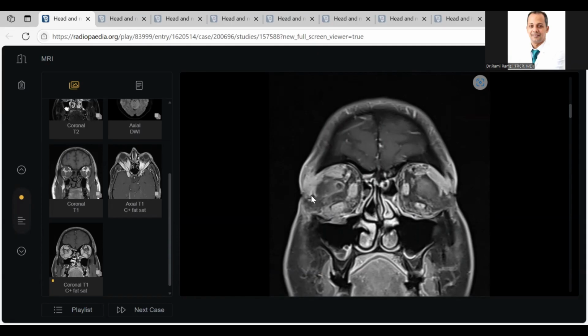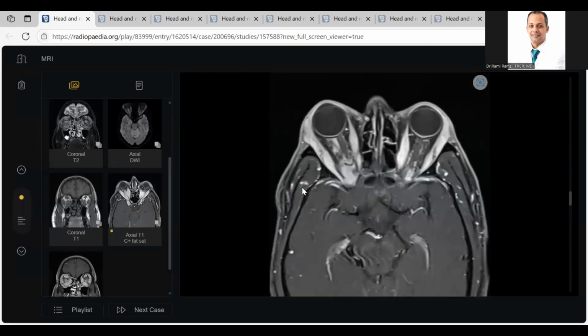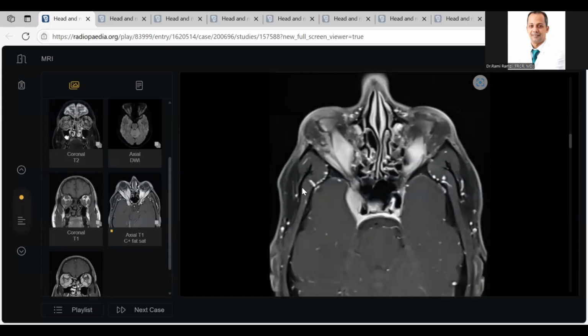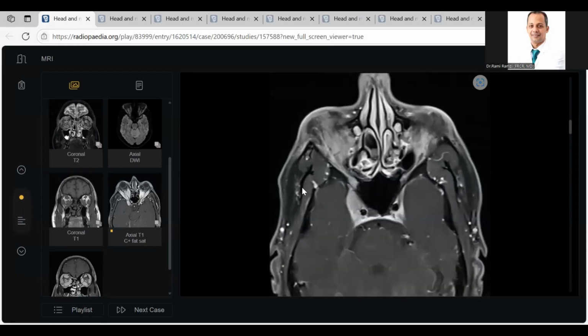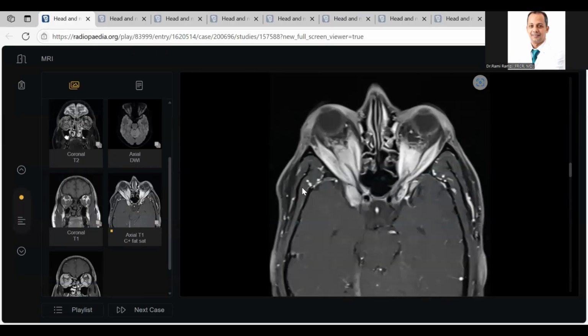What is the differential diagnosis? By the way, you are correct. But why is this not thyroid orbitopathy? There was a differentiating point. There is no Coca-Cola bottle sign, and I cannot appreciate it. The individual muscle bellies are not swollen, but there is extramuscular soft tissue.